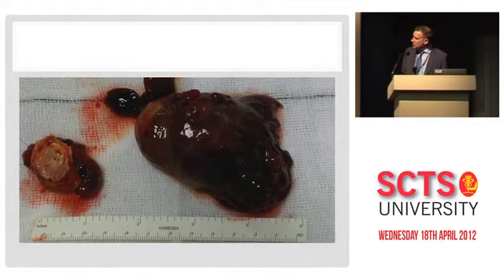There's the specimen the surgeon's resected, and you can see on the left of the picture, that's the actual piece of septum that the myxoma is attached to.